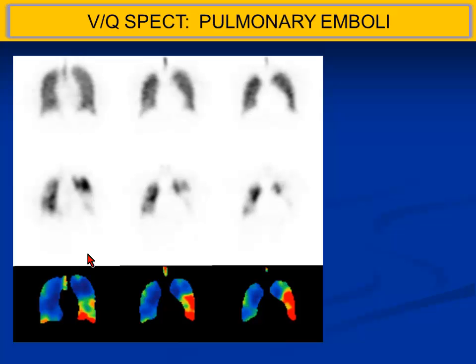If there is patient movement between the ventilation and perfusion, it will show some diffuse red areas. If it's quite diffuse throughout the lung, it is often due to patient motion. Also be careful using the VQ quotient, because during ventilation the lung is larger than on perfusion since patients keep breathing, and that could cause a diffuse mismatch at the base.